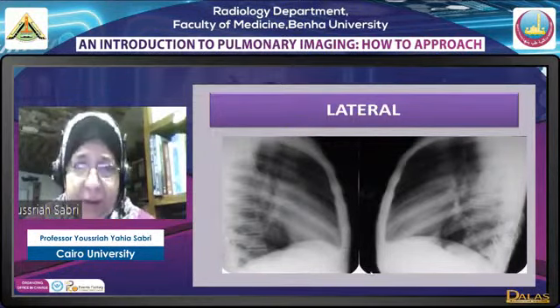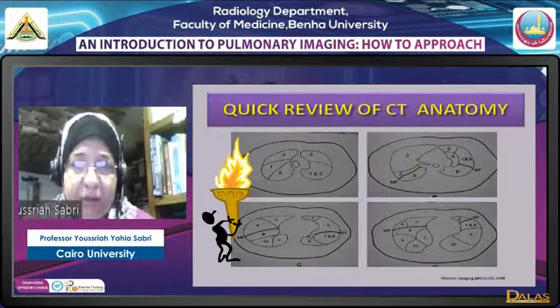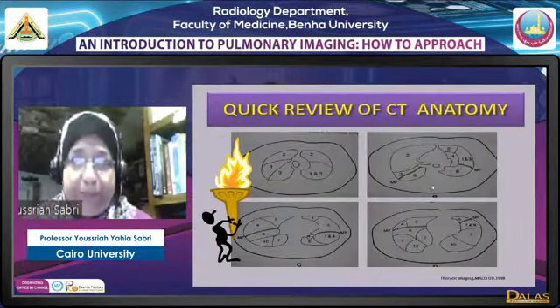Sometimes actually it's very difficult, but if they can be seen separately you can identify it. Quick review بقى للCT anatomy.